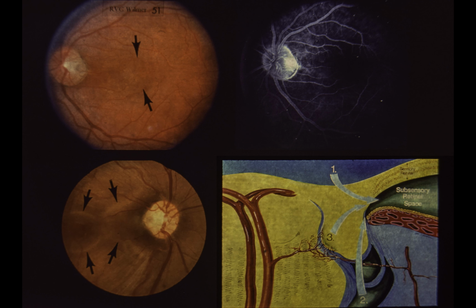No treatment was recommended for this patient, and she maintained 20/40 visual acuity. Her sensory detachment eventually flattened spontaneously. Some authors have advocated photocoagulation for serous retinal detachments associated with optic pits.